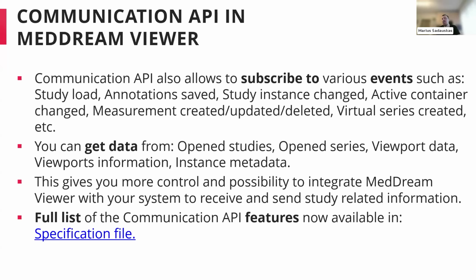You can get information about viewport data: how many viewports are opened, what each viewport contains, what study instance UID, what series instance UID, and so on. You can also get instance metadata with, for example, the patient information and the image information, like min-max values, center values, and so on. All these things give you much more control and possibilities to integrate the MedDream Viewer into your system, and to receive and send study-related information.